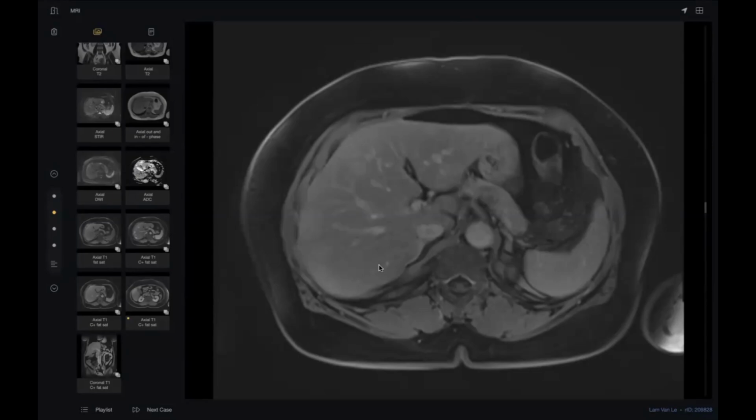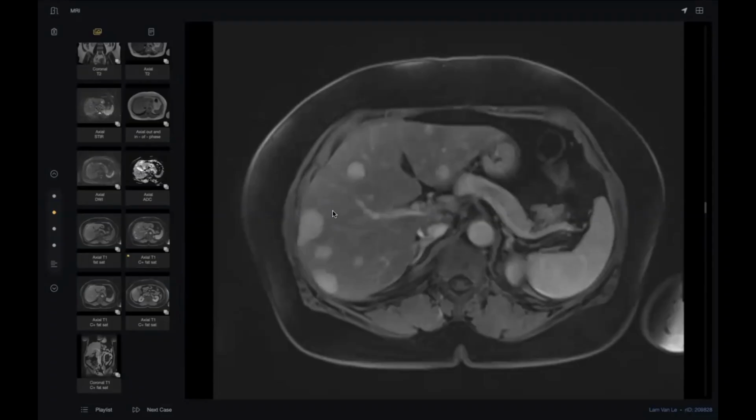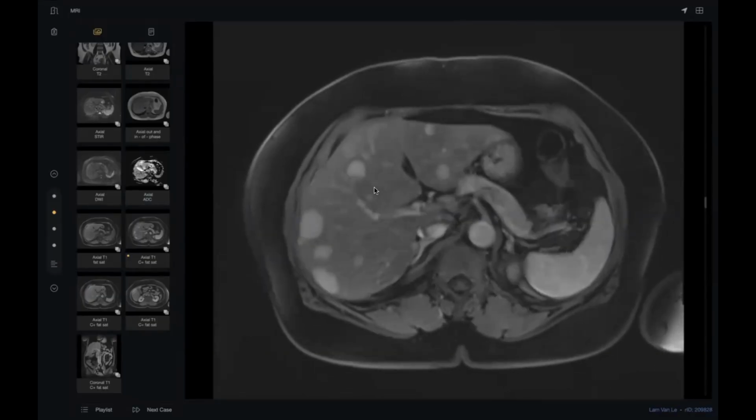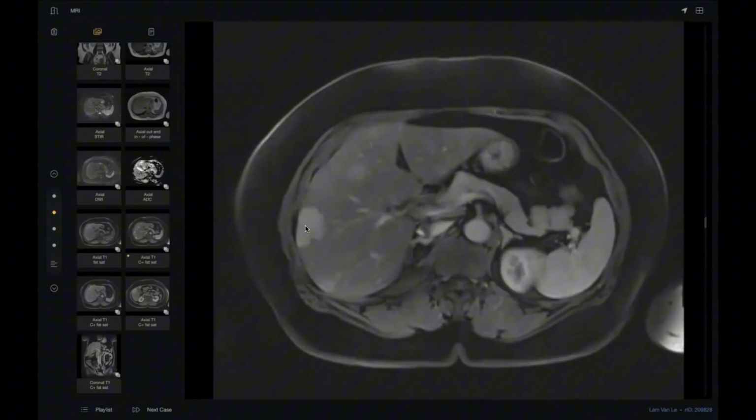The opposite is adenoma. Will adenoma enhance or not? No, it won't enhance. Why? Because it doesn't contain normal hepatocytes. Okay. This is the sequence. And here, what happened? This is not hemangioma. Here in arterial, complete enhancement. Your first differential diagnosis, number 1, HCC, number 2, FNH. No hemangioma. Hemangioma must be peripheral, discontinuous, not complete enhancement like this.